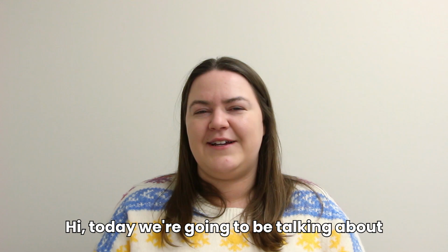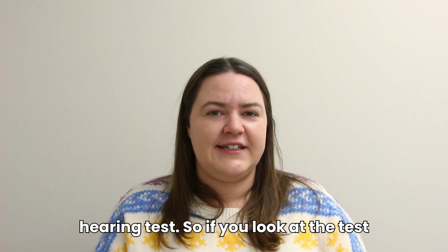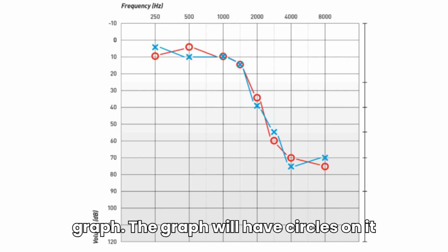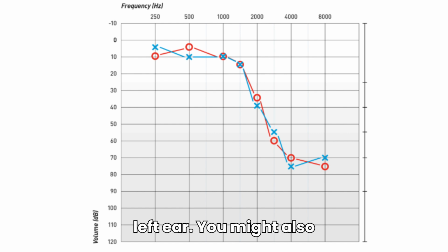Hi, today we're going to be talking about how to interpret the results of your hearing test. So if you look at the test in front of you, you'll probably see a graph. The graph will have circles on it and X's on it. The circles are for your right ear. The X's are for your left ear.